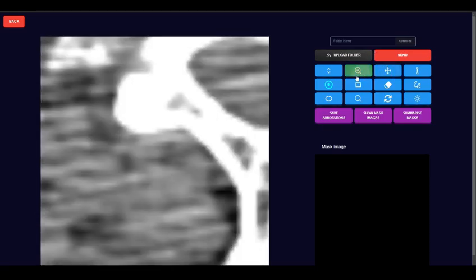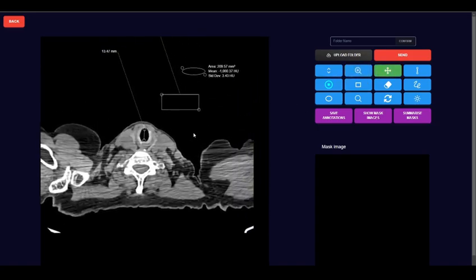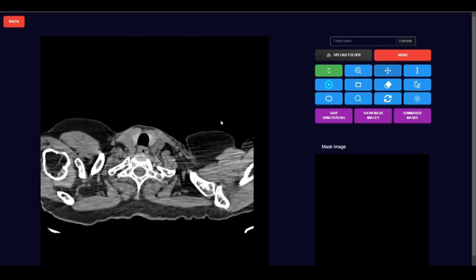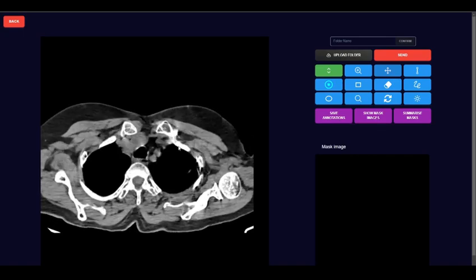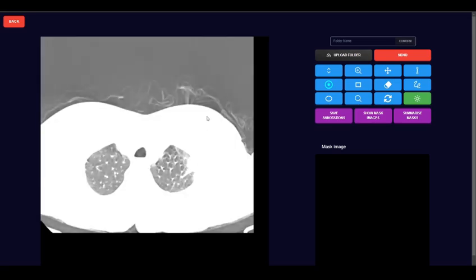There's also another important tool that I think is important. So let me scroll down till you can see the lungs, and I'm assuming these are the lungs. And another tool is the shade tool. So if I just click, hold, and move, you can see the brightness has decreased completely. You literally cannot see the DICOM image. Now if I do the same thing but move upwards, the brightness has increased, and you can see that the lungs are being very clear over here.